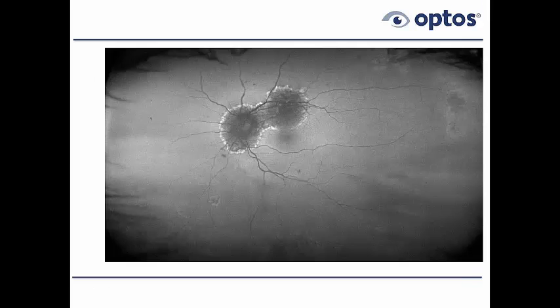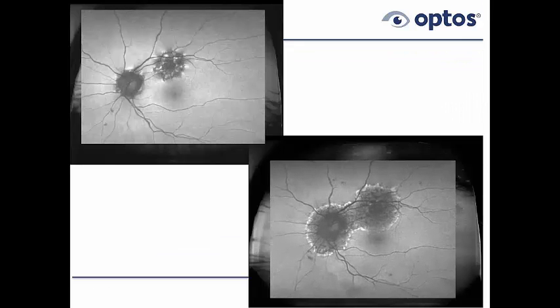It's probably missed a lot because, again, it's occult, which means hidden. You don't see it. It's invisible to ophthalmoscopy in early stages. Eventually, there are pigment epithelial changes that you will see with an ophthalmoscope. But in early stages, Azor is truly, in my opinion, I've seen a few of these, completely invisible. We've published a few, and later on, they may become much more obvious. But it truly is not that rare of a disease. If someone could put together a series of 300 or so, it must be much more common than we ever thought. And there's that comparison again.